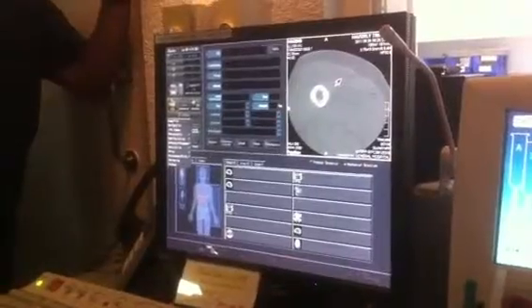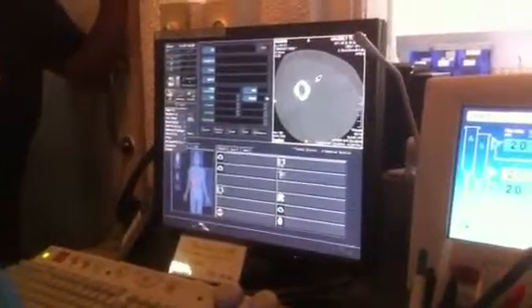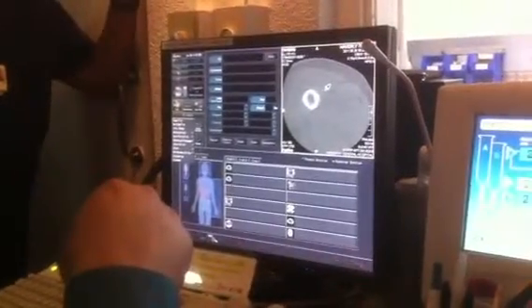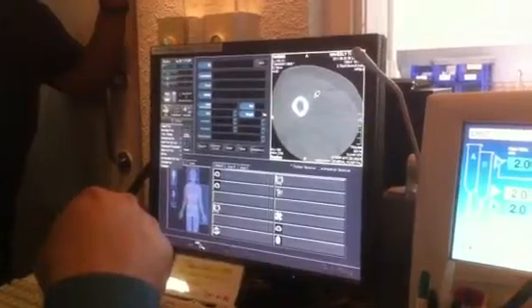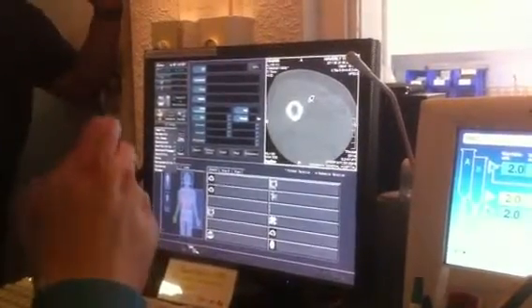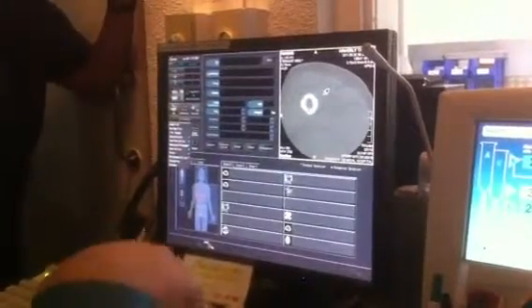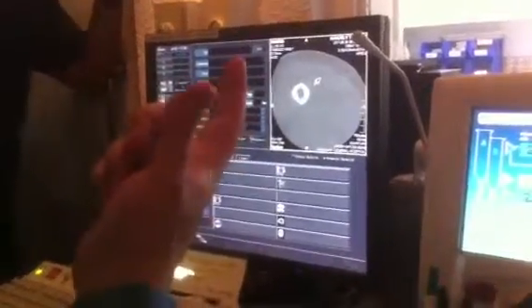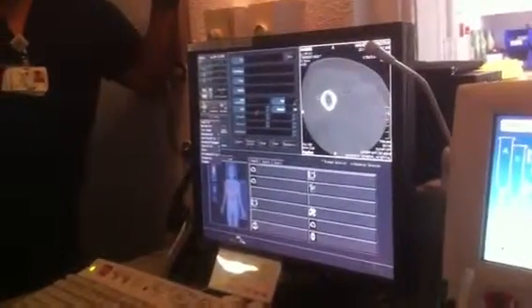Let's say you did a head and neck, and you got to do something on the neck, or maybe you coned the neck off too small or something like that. Because the neck was the second one that you chose. And then the boost is on the neck, but we chose the head, so it's not on the head. So the only thing you're going to see are the head images, not the neck, because it shows what you first picked. It shows the accession number you first chose.